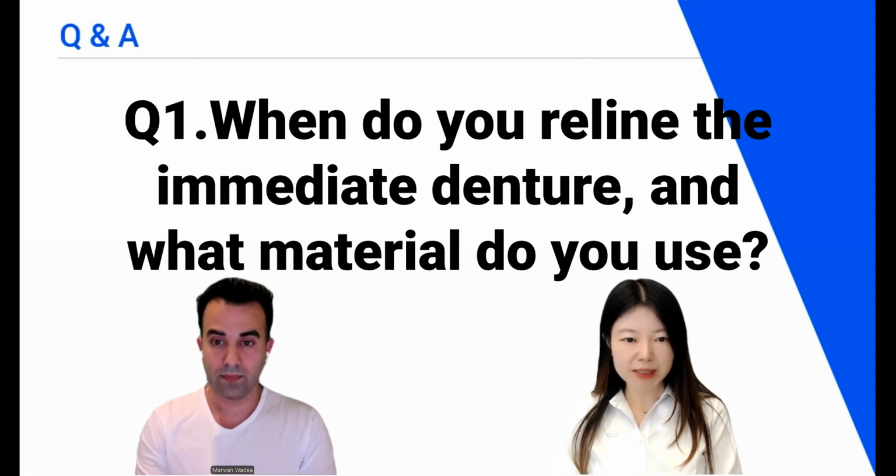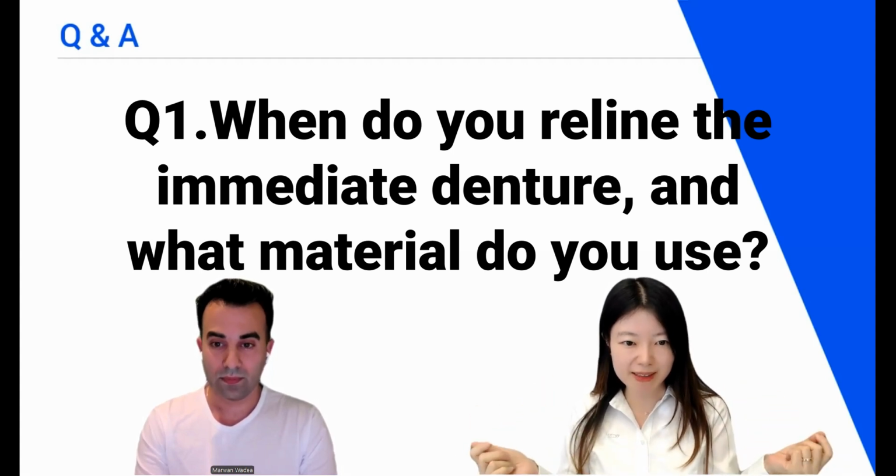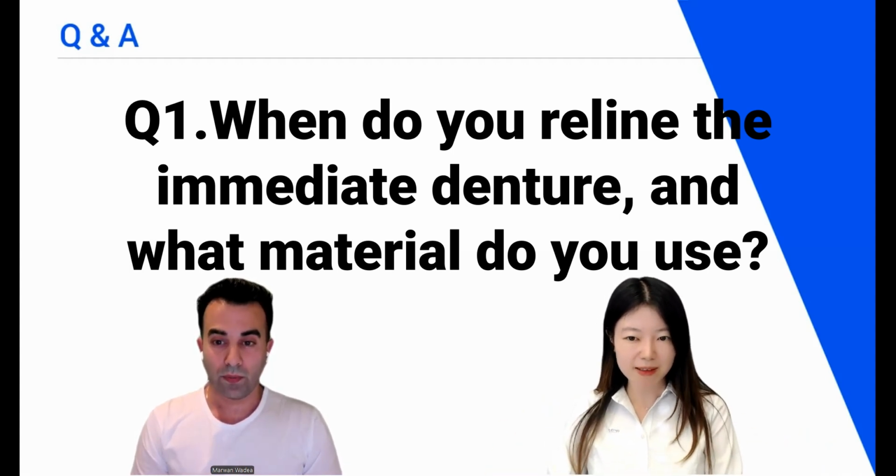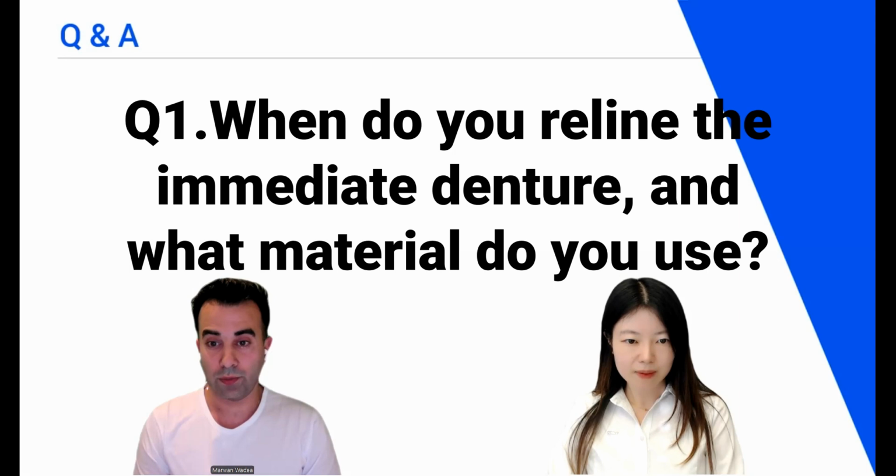So in the beginning 6 weeks, you wait without using any soft material. And after the tissue has settled down, you use a soft material inside the denture as a base. Correct, yeah. After 6 months, a hard material. Correct, yeah. For the first week, the swelling will keep it in place, and after that, denture adhesive cream. Usually the patient would buy it from the pharmacy, and that would help provide retention for up to 6 weeks.